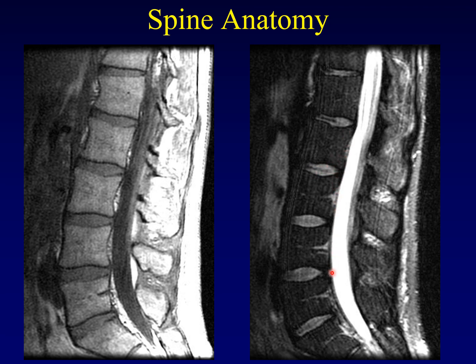Still very smooth line. Hey, what happened to the spinal cord? A little while ago we had a spinal cord running through the thoracic region of the spine. Where is that here? Well, the spinal cord doesn't go all the way to the bottom of the thecal sac. It terminates somewhere around the thoracolumbar junction, and so all we have left when we get down to this level are the nerve roots sitting in the cauda equina extending out through the foramina.